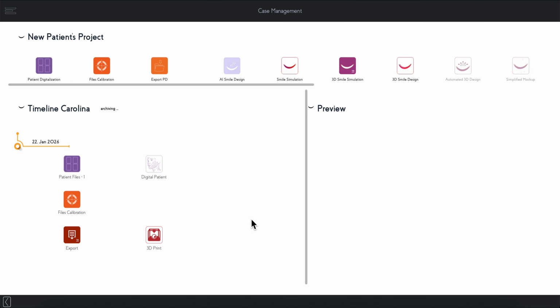At this time, the files added in the calibration data are being sent to our servers, where the images will be processed, segmented, and returned to your app in a brief moment. Please allow the app to finish this process.